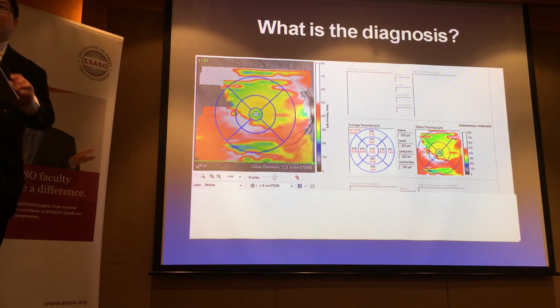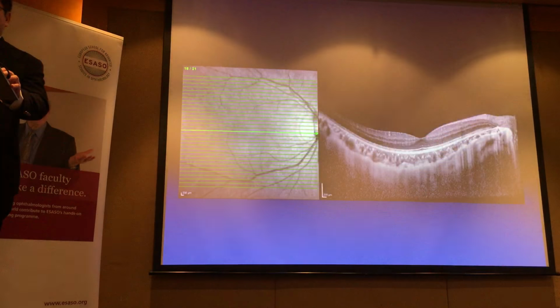So many studies are quantifying the choroidal thickness. How do you propose to measure the choroidal thickness, because we really don't know the outer extent of the choroid on the OCT? How can we measure it? So on the OCT, you can actually get a good visualization.